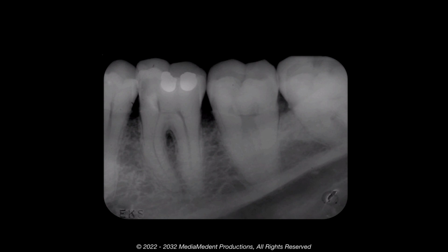And second, while good alveolar bone height will enhance cervical burnout, root caries is usually preceded by bone loss. The arrow is pointing to cervical burnout on the mesial of the mandibular left third molar. Note there is no cervical burnout on either proximal surface of the first molar that is involved with severe bone loss.